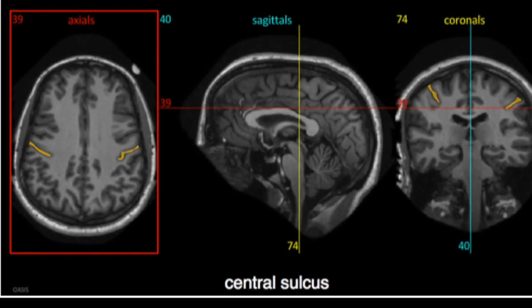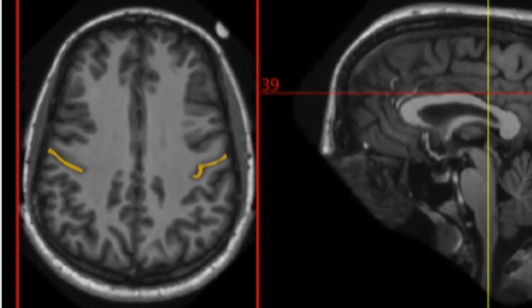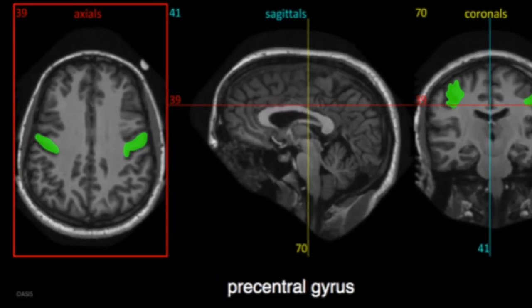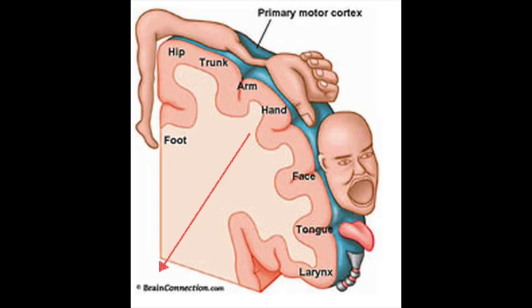You can see the central sulcus marking the boundary between the frontal and parietal lobes, bordered by the pre- and post-central gyri. The precentral gyrus is your primary motor cortex, so corticospinal and corticobulbar. Voluntary motor tracts to the body, neck, and face, respectively. Motor is a descending primary efferent tract, so in other words, it's the start point of your motor pathway, and that large bundle of axons is just heading downwards towards the face and body.